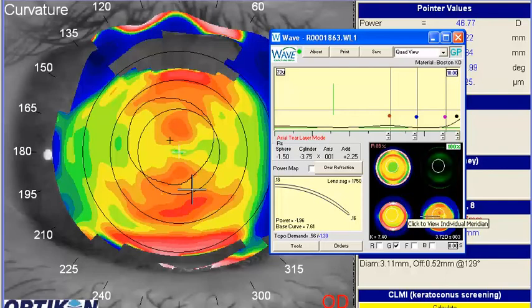One of the things I always try to remember is that if I'm opening up a new lens, if I need to address that issue, I try not to start with the previous lens. You have to go back to scratch and start with a new design on that particular lens, as Wave doesn't let you choose that after the fact. So this one here, again, we're a little bit spherical.